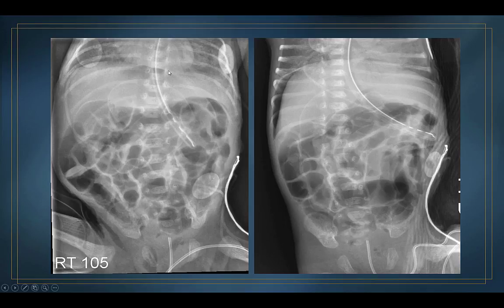but here you see the cupula sign again. You see the Rigler's double wall sign. And there's Rigler's again in multiple places, but clearly the decubitus is always the best. And this, again, it's important to impart this to our neonatal colleagues, because at 1 or 2 in the morning, this is the best view for them to prove. You don't want to have the diagnosis of free air delayed for 5, 6, 7, 8 hours, because the baby may continue to deteriorate if that happens.